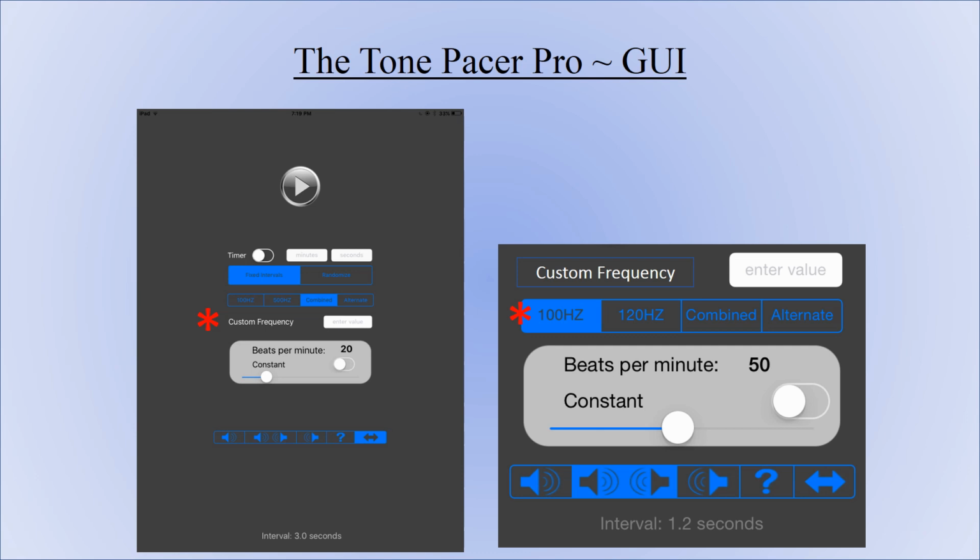And much like setting the parameters on the timer, you select the tone that you want to change to a custom frequency by tapping it. If you look at the illustration on the right side of the slide here, we're going to tap the first field for tone, which we'll call tone 1, to select it. Then you'll tap in the blank field next to the custom frequency label. If you want to change the custom frequency of tone 2, you tap and select on the second tone field and tap on the custom frequency label field, which will pop the numeric keypad. Very similar to how you change the timer settings.